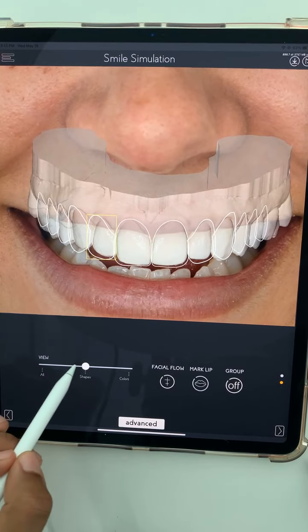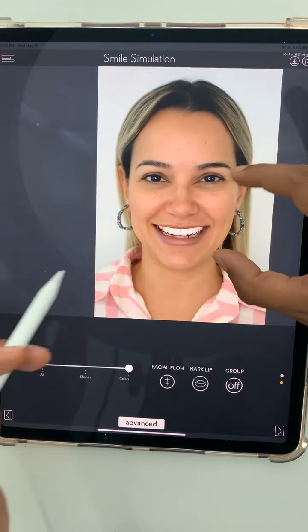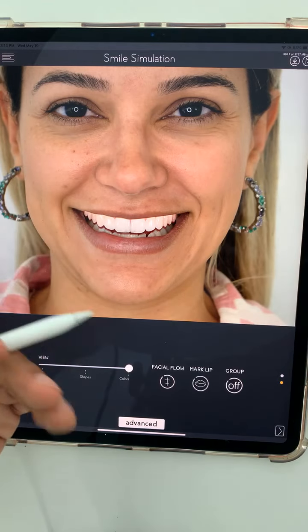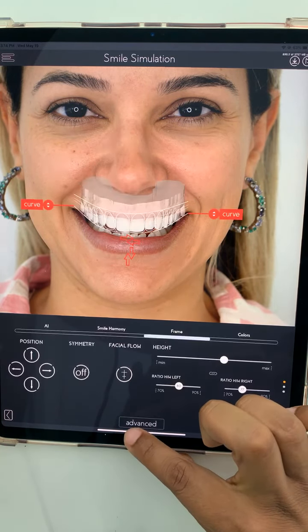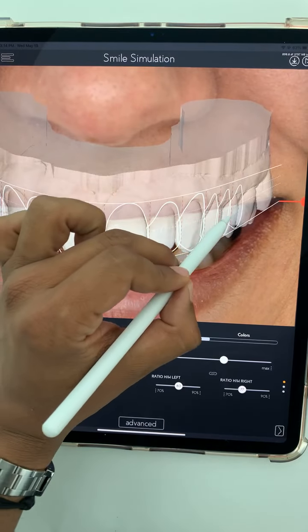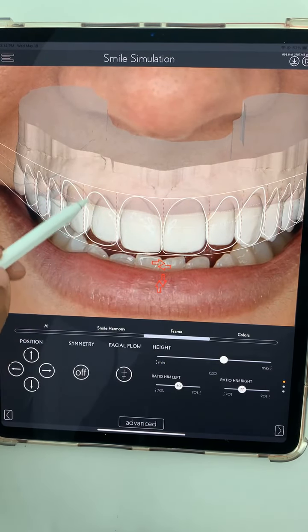Before, when I had my design like that, I was only able to educate my patient, to show my patient what we are envisioning for these restorations. However, when I add my intraoral scan, I see here that my smile frame, my smile outline is not 100% well positioned.